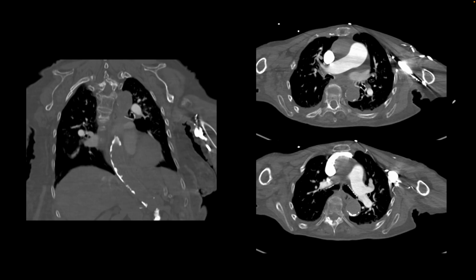This is our next patient, and here we performed a CTPE study. The CT was negative for PE, and we found insufficiency fractures, which are seen right here, and also a healing fracture there and right here. And so look at the bones, because sometimes patients may present with chest pain, and even without trauma, especially in older patients, they may have insufficiency fractures.